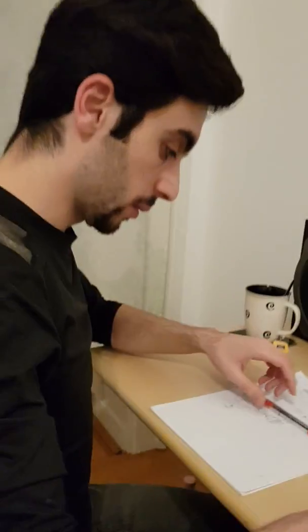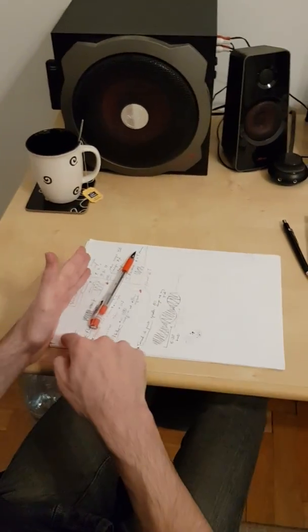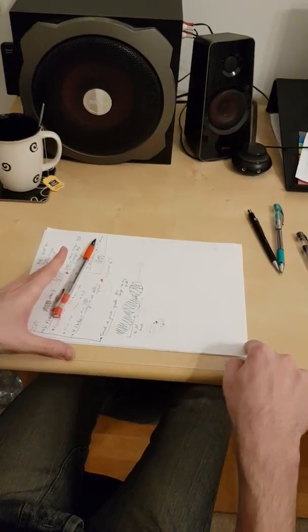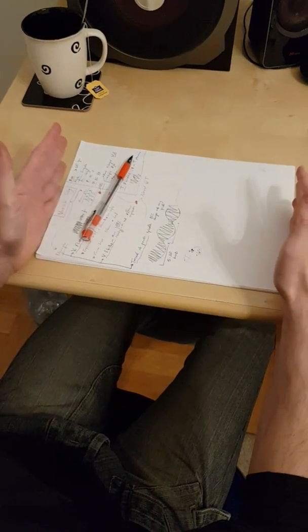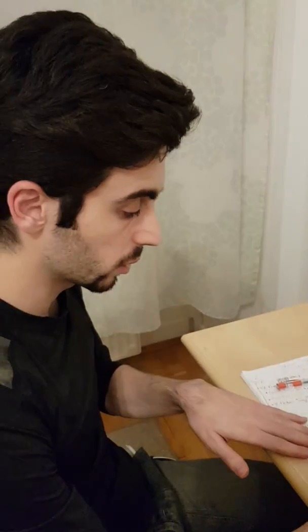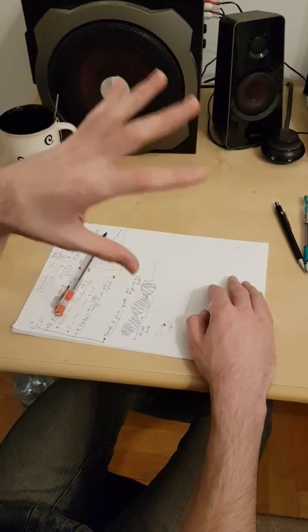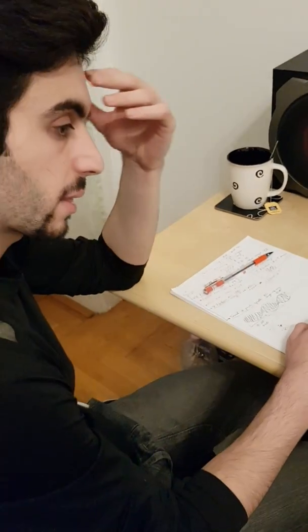For example, let's say this is the duration of one heart cycle. It starts with a P wave, then QRS and T, and here starts another P wave. So before the beginning of this P wave, this is one full cycle. For a normal heart rate, from 60 to 100, the QT range should be from 0.35 to 0.44. Of course, it differs between males and females, but that doesn't matter. Let's take 0.35, just to make things easy. 0.35 is almost a third of a second, right?